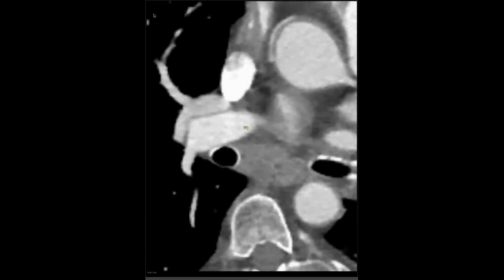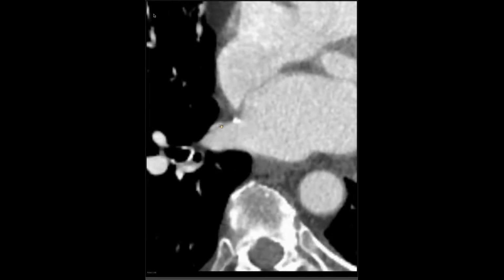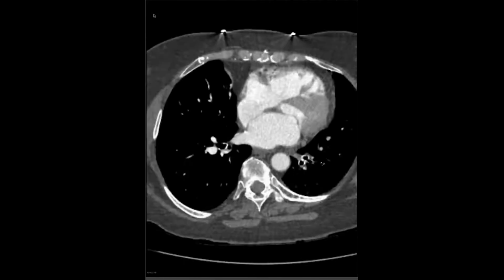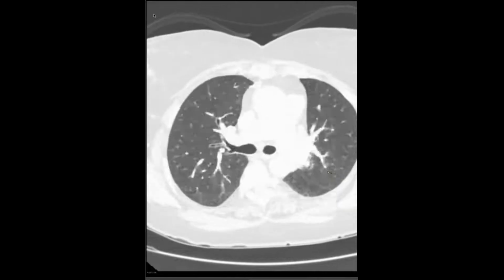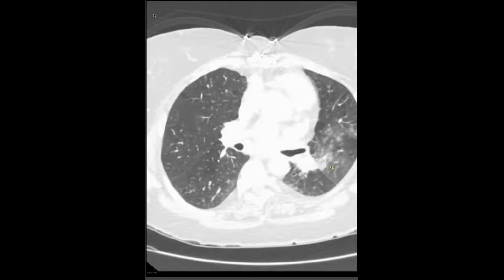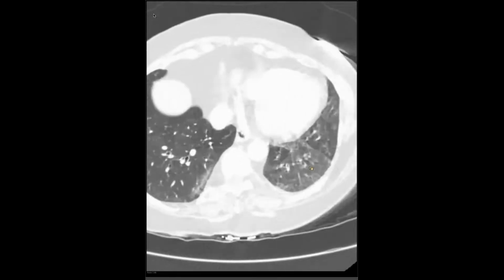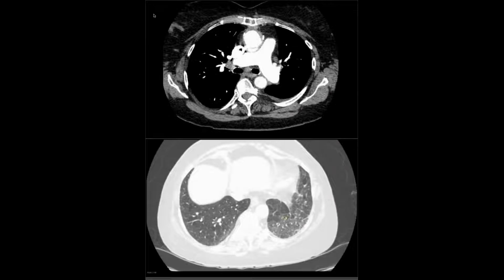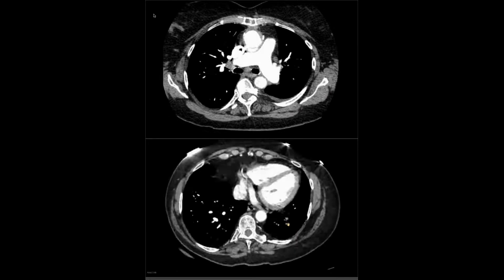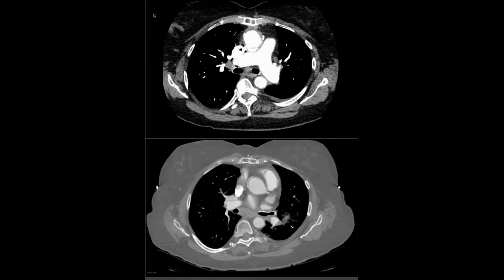with it as well. If you look at the right side of pulmonary veins, you see some calcifications associated with the right inferior pulmonary vein as well. And then interestingly also, she's got some either edema or maybe mild infarction involving the left upper and lower lobes, which has kind of waxed and waned over several exams. And her left lower lobe pulmonary artery has also undergone a change serially.